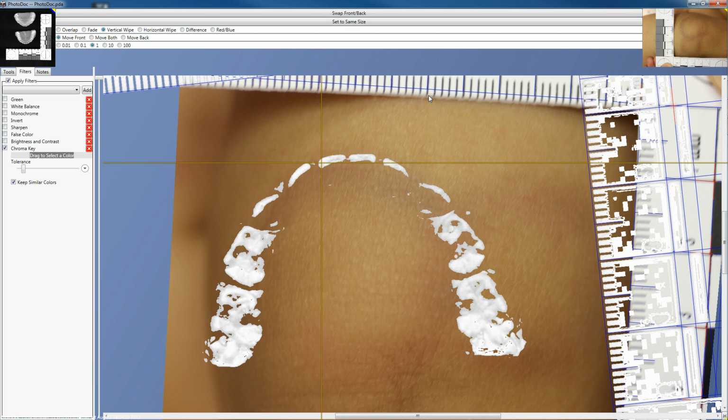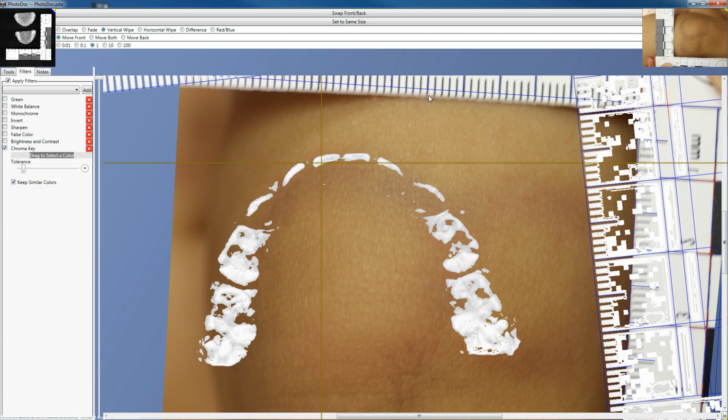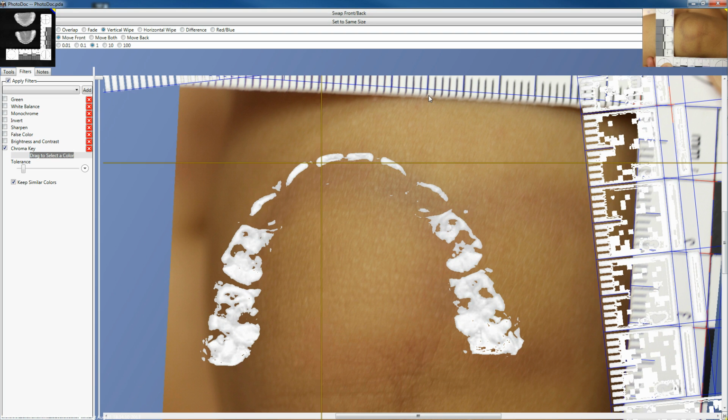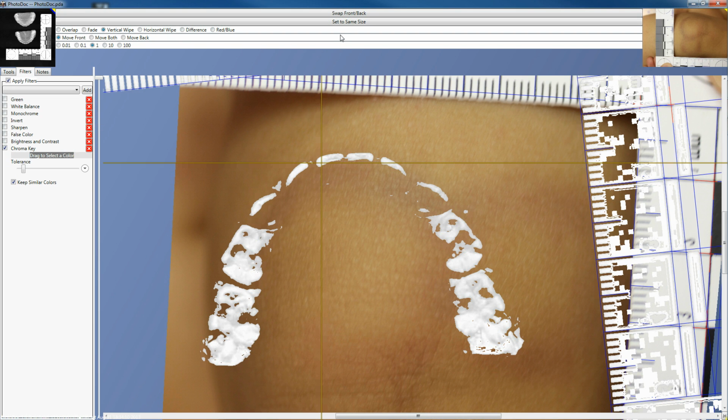Using the arrow keys, we can move the mold, overlaying it over the bite mark. Because both images had rulers in them, the computer is able to ensure that the images are the same actual size. We can also swipe between the two images, allowing a detailed comparison of each tooth with its putative marks.